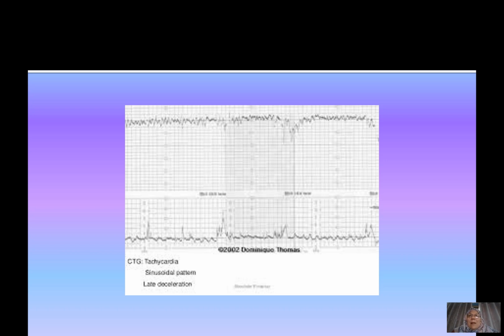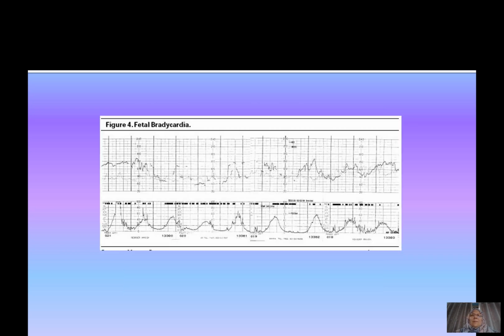However, there can be other causes. It can be that the patient has an infection like influenza or something like that, which causes her to have a temperature. This is something that needs to be assessed in the clinical context. That goes beyond our lecture here, because we only want to get some practice looking at CTGs at the moment.